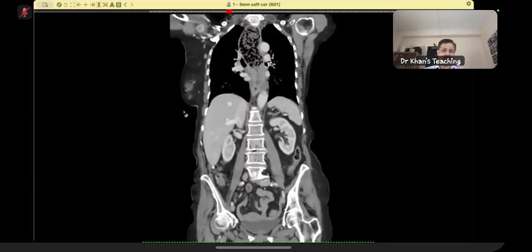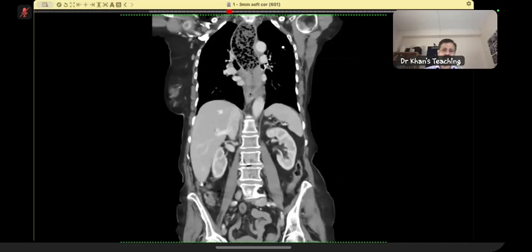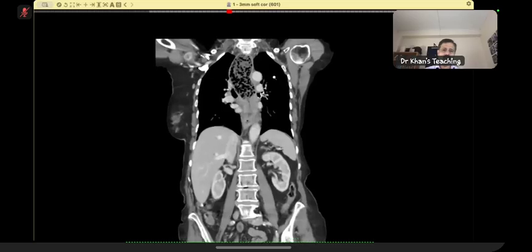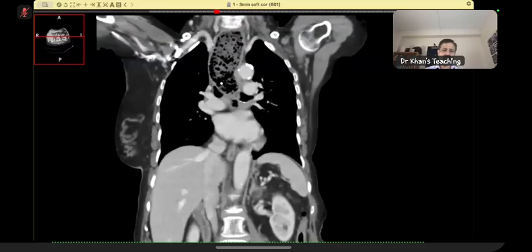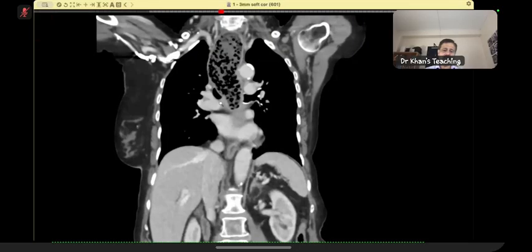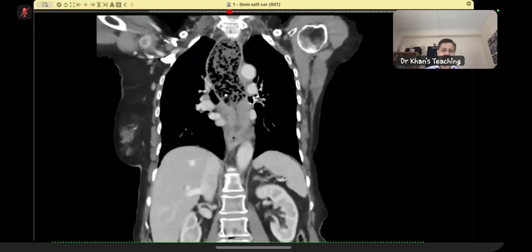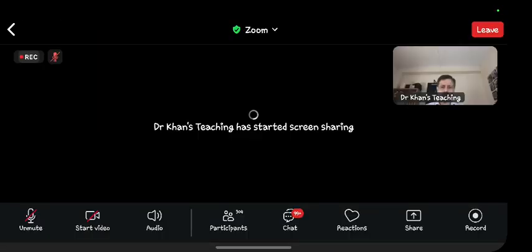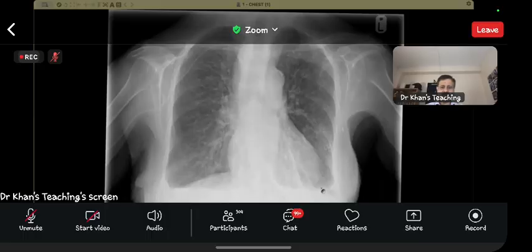I'm particularly happy that you also asked for the lung windows for aspiration. And just to develop your eyes, look at this esophagus and how it goes to the other side, and still there is no aspiration. We have a chest X-ray from a few days later, which is also a potential exam case.